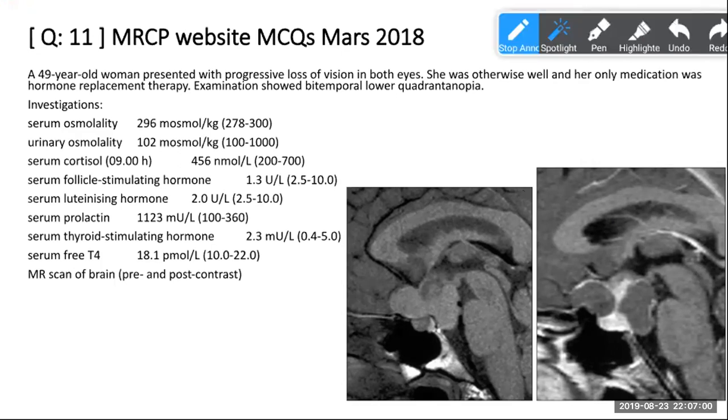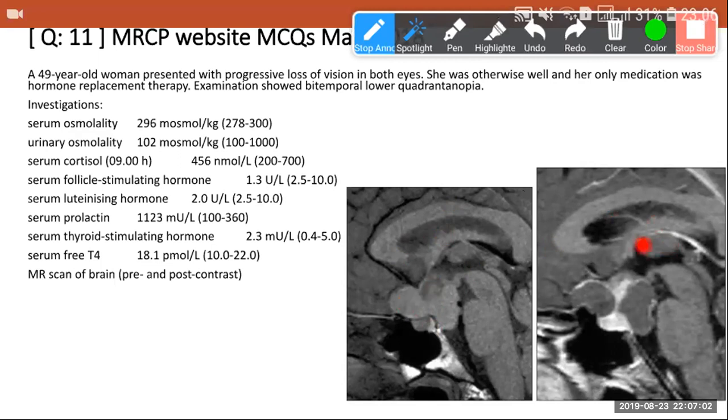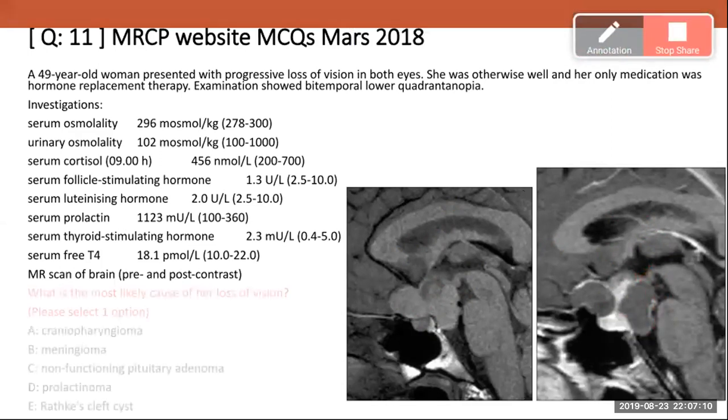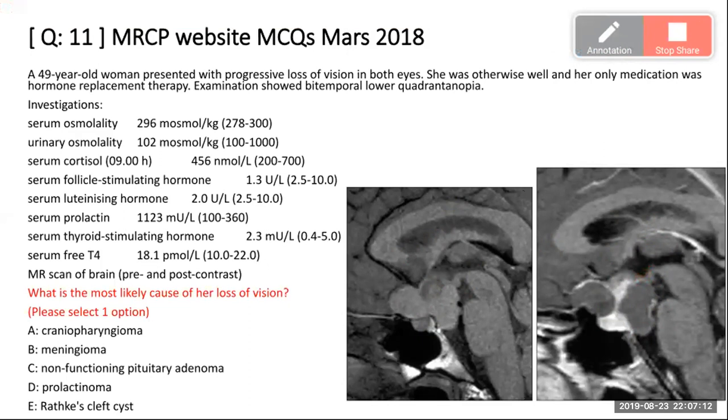This is pre-contrast, and this is post-contrast. Okay, and this is a cystic component here. Cystic and solid component, craniopharyngioma. Yes, this is a craniopharyngioma. Craniopharyngioma usually has cystic and solid components, and may be present in the young, with another predominance in the 50s to 60s. Yes, exactly.